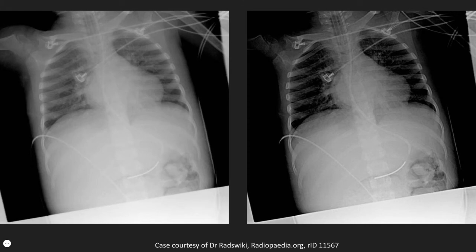This is my last cardiac example. The 2 images are the same acquisition but have been windowed differently. There is a double heart border, seen best on the more aggressively windowed image, with splaying of the carina in keeping with left atrial enlargement.